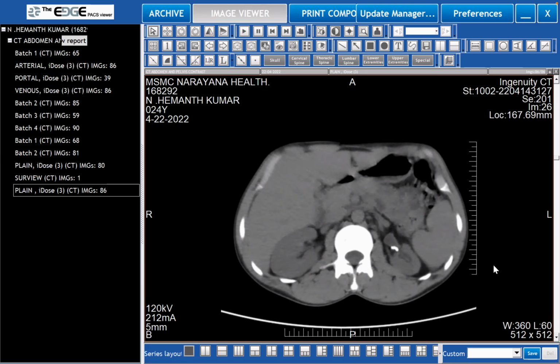When you see abnormalities of this nature, the kidney is smaller in size, certain pathological features will be present in that kidney, and those pathological features might reflect on a CT scan, which is able to show us tissue differentiation. You understand my question, or is it too complicated? The idea is to know what the consequences of this sort of radio densities in the kidney will result in. And that can manifest as certain things in the kidney. For example, if you look at this kidney, you must say whether there is any evidence of perinephric stranding.